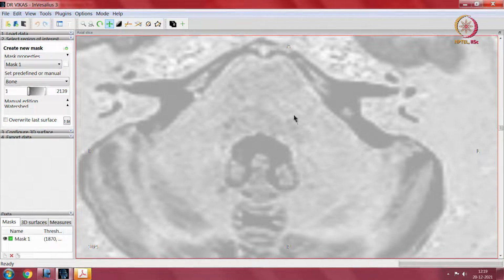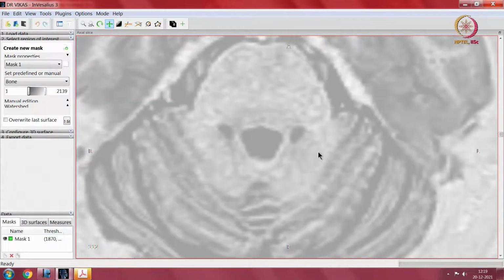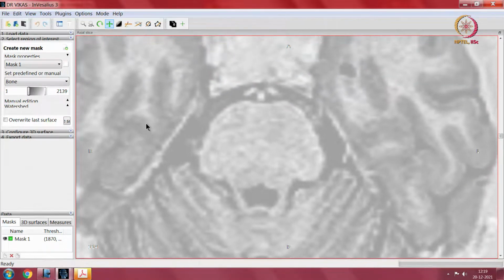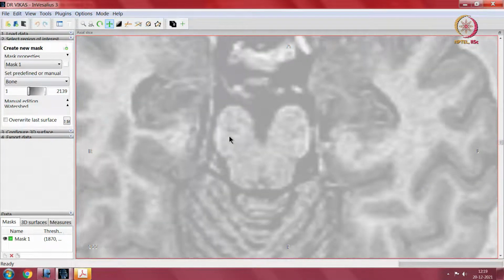These are through something called cerebellar peduncles, superior, middle and inferior. So, this is the cerebellar peduncle. We come up, this is still the pons. Posterior fossa, and this white stuff which is seen is the petrous bone. Yeah, so I think this structure should be familiar to all of you by now. So, this is the midbrain. We started from below, we come up from medulla to the pons and to the midbrain.